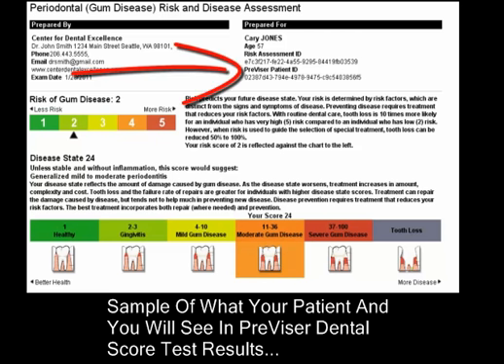This very long number is HIPAA compliant and is how the patient is identified on PreViser's computers, not the patient file stored on your computer, which is organized by name, but on the master database that contains all records of all patients assessed anywhere in the world by PreViser. These are stored in disidentified form, and that's why they're HIPAA compliant.